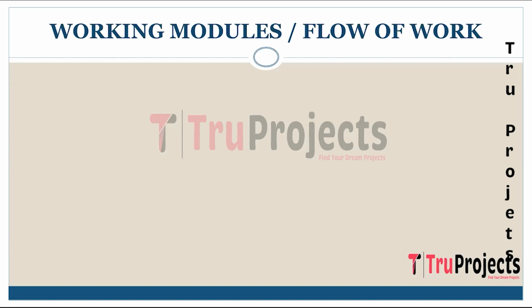To implement this project, we have designed various steps in the flow of work. The first step is importing the packages. This initial step involves importing essential Python packages and libraries that are crucial for various aspects of the project. We have imported NumPy for numerical operations, Pandas for data manipulation, TensorFlow for deep learning, Matplotlib and Seaborn for data visualizations, and Scikit-learn for machine learning.